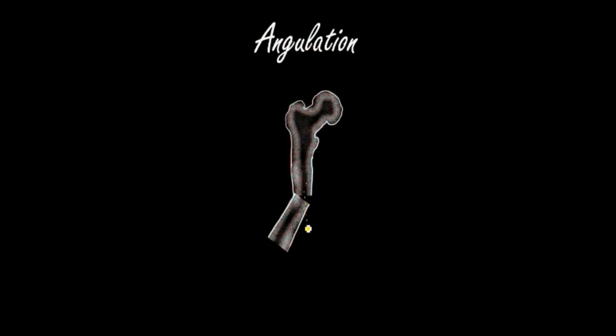So for example, if you just have this as the axis, we'd say this is something along the line of round about 40 to 45 degrees of angulation in this case. Yeah, it looks about 45. If we were to make this again lateral and medial, you'd say that this is a transverse fracture of the midshaft of the femur, and the distal fragment is angulated 45 degrees laterally.